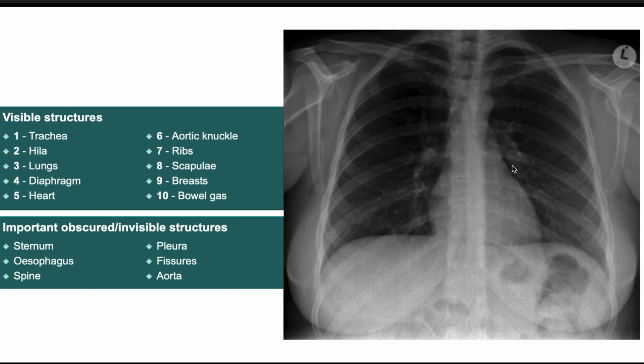As a radiologist or as a doctor, you usually need to check the cardiothoracic ratio. You first measure the distance across from the costophrenic angle on the left to right or right to left, and then the width of the heart from the right ventricle to the left ventricle, and it should be no greater than 50%.